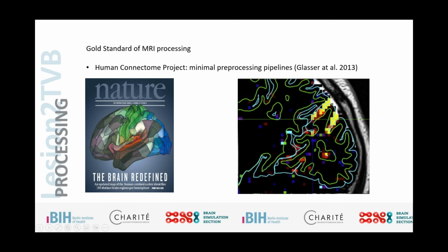This is one of the first instances where we can already see a little bit of an issue when we're talking about this kind of processing. It's just the sheer difference in resolution and in properties of the acquisition technique itself. Even though the HCP data is of the highest standard, and we're talking about sub-millimeter resolution for the structural data, we still have the functional data being rather pixelated, as we can see here. Right? So we see the overlap of the cortical ribbon and the voxel actually not being a perfect match simply because of the difference in resolution of the acquisition technique. So there's a lot that we have to control for if we want to actually have an accurate representation of our functional, but also of our structural properties that we're trying to capture.